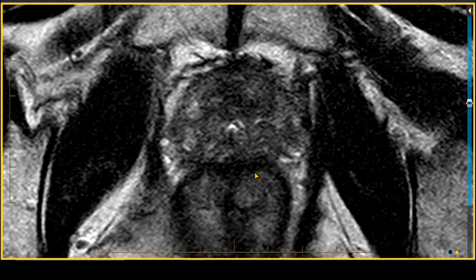So if we take a look at the axial T2-weighted images, and remembering that in the transition zone, the T2-weighted sequence is the king, you can see that there's this area of moderate, homogeneous T2 shortening within the transition zone that's non-circumscribed. So it has very, very fuzzy margins, okay? This measures over 1.5 centimeters in size.